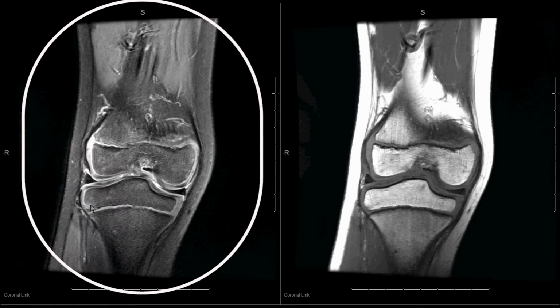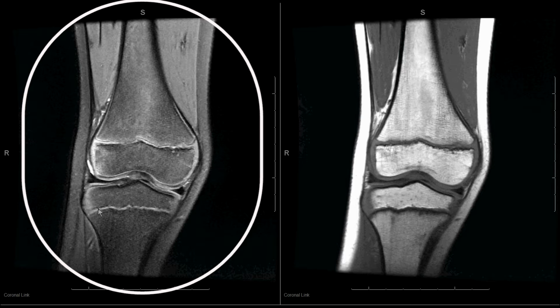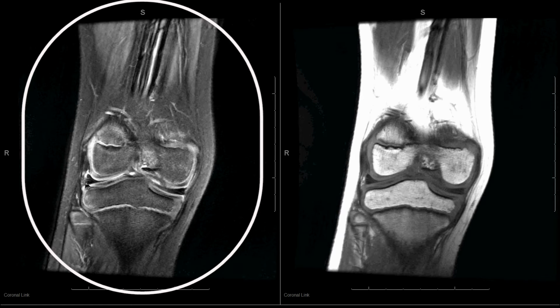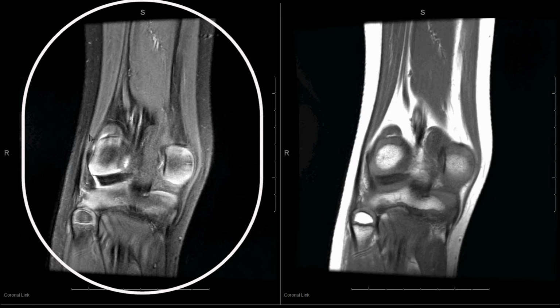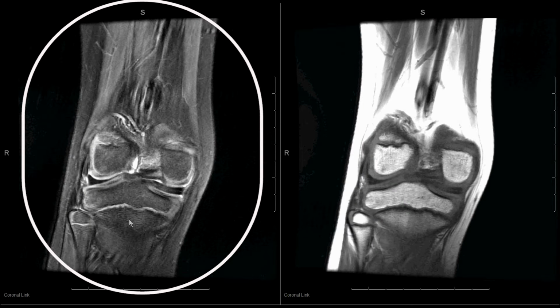Let's look at the lateral collateral ligament now. First, anatomy. This is a complex of 3 different insertions. We have the fibular collateral ligament, which is seen here. We have the biceps femoris tendon, and we have the iliotibial band. All 3 of those are inserting into the fibula and forming this compound tripartite ligament complex.